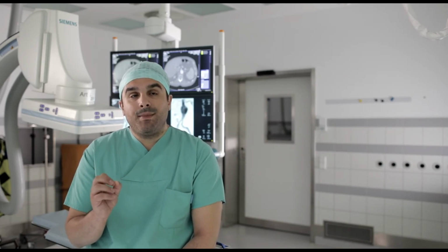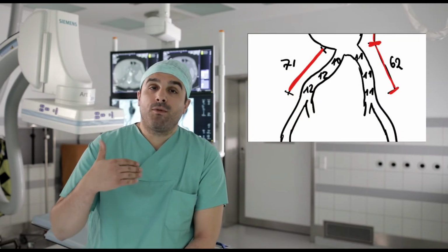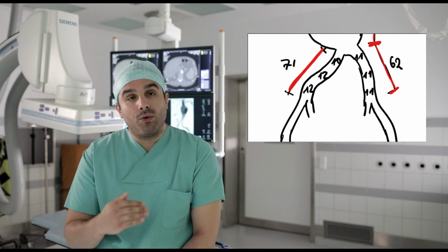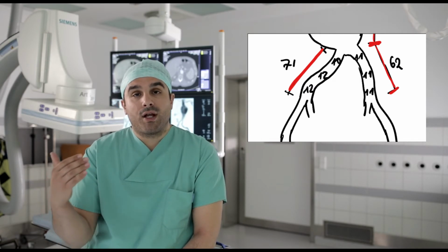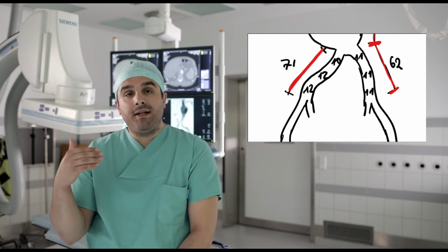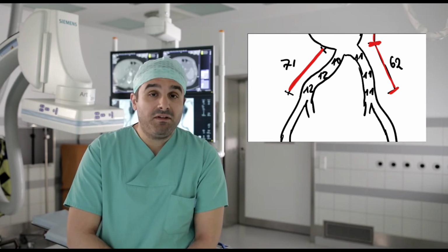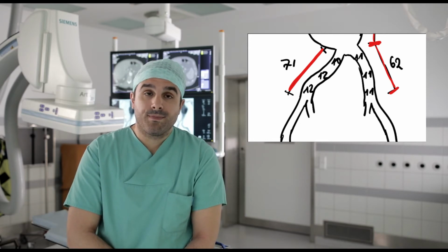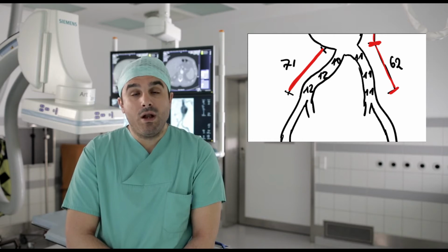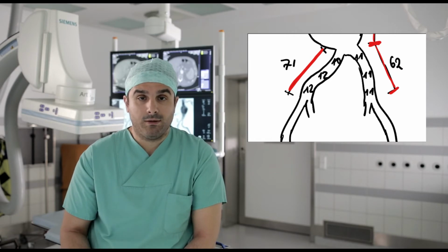The final step will be to measure the distance and the diameters of your distal landing zone and your access vessels. You have to measure from the aortic bifurcation up to the origin of the hypogastric arteries. Then you have to add the diameters of the common iliac artery and to find the ideal zone for landing with your limb. The length should be at least 15 millimeter. However, this depends on the IFU of the device. Keep in mind that in case of long, healthy common iliac arteries, you do not have to stent the total length of the vessel.